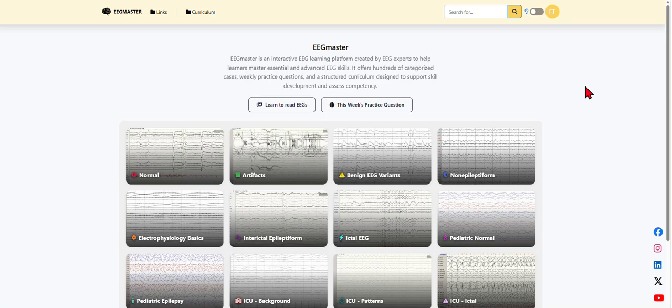In this video, I'll walk you through the key educational resources on the EEG Master website, including our atlas, competency-based curriculum, and self-assessment tools. Everything shown here reflects what trainees will typically see in their learning environment. A separate video is available to show how registered programs can review trainee progress and evaluate institutional performance.